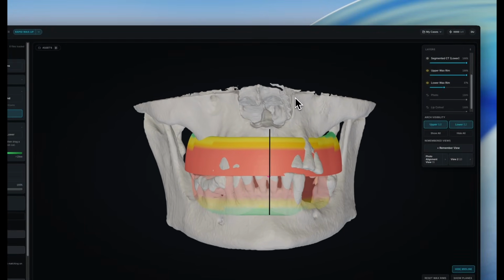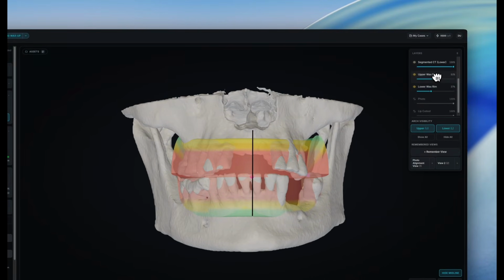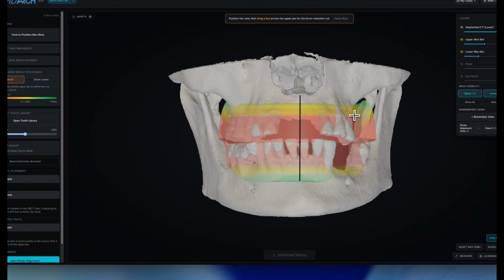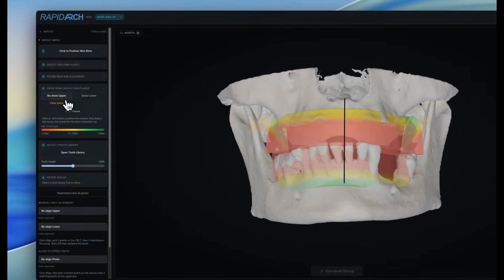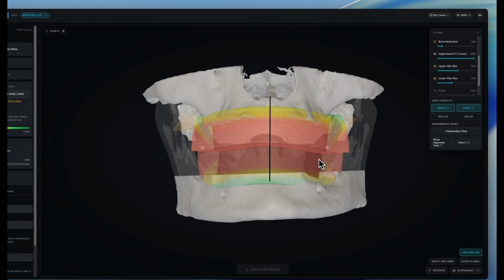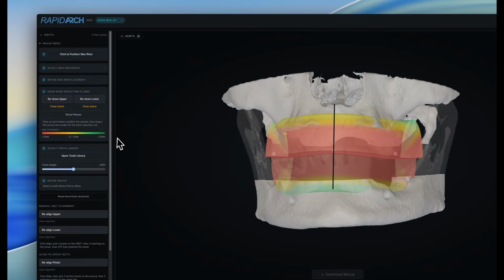So next here is I'm going to cut my alveoloplasty. So where the red meets the yellow is about 12 to 15 millimeters. This is closer to 12 millimeters, which is about my minimum restorative thickness for zirconia. And I'm just clicking and dragging, and a little bit more than 12 millimeters there. This basically guarantees that I'm going to have enough restorative thickness.